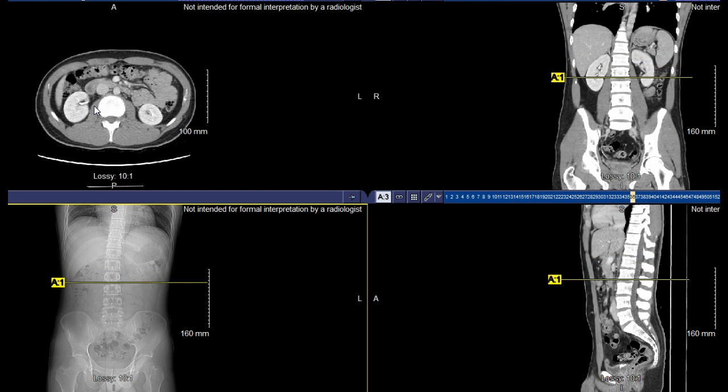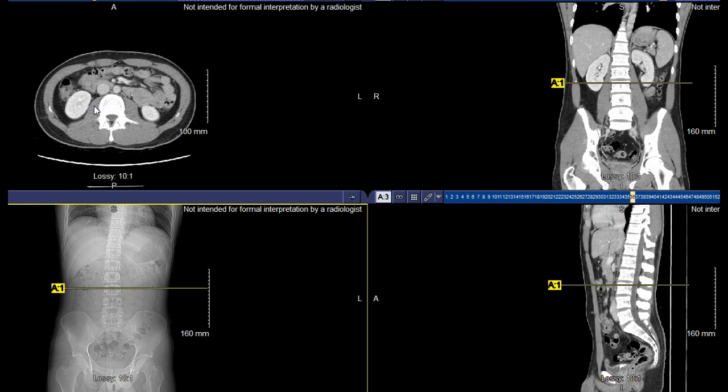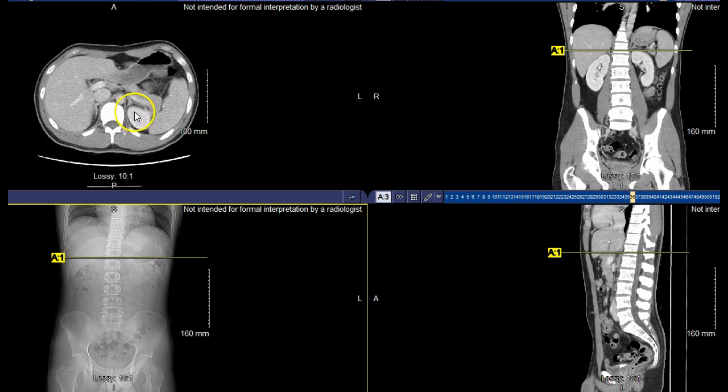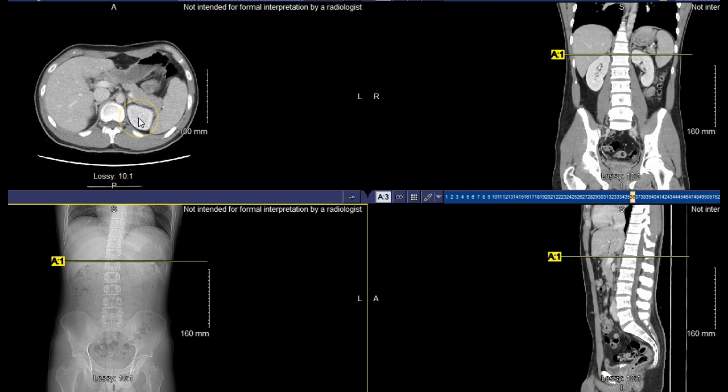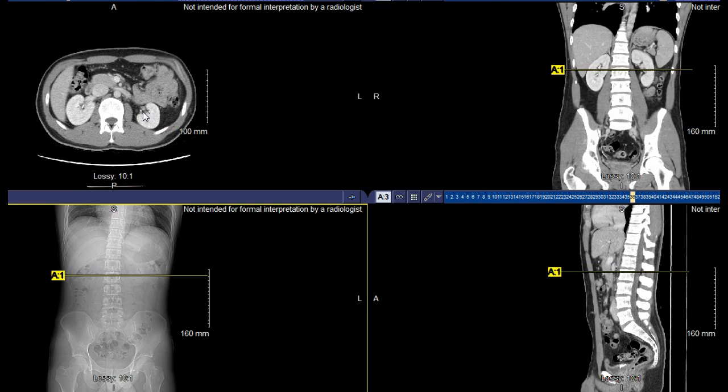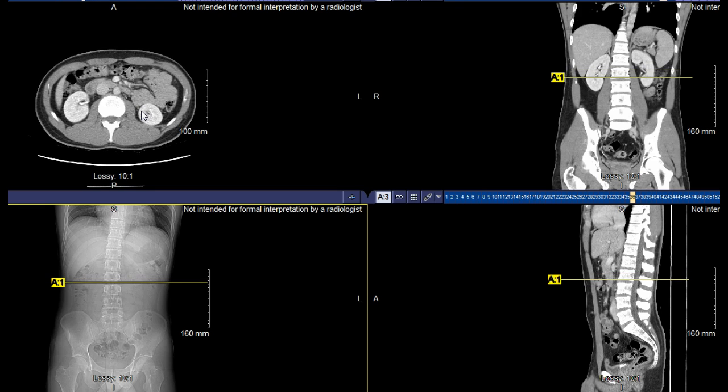Then just to kind of highlight some of those kidney-based structures, let's just go top to bottom again. We can start to see the left kidney kind of coming down, down, down, down. And you can see the position of the hilum is going to differ from patient to patient. So you can see kind of that bean shape right in through here. So there's the hilum. The bright contrasted structure would be the structure of the ureter. So we can see where that structure is located there respectively. And you can kind of follow the ureter down.